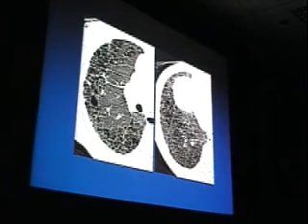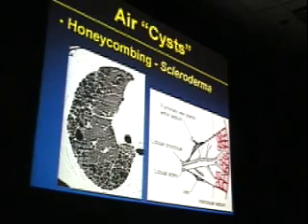Another patient with air-filled cysts on high-resolution CT. Notice that these cysts cascade one on top of another. They're variable in size. They're variable in wall thickness. And in this portion of lung, at least, they are distinctly subpleural in distribution. What is this an example of? Okay. This is honeycomb lung. Right? This is honeycombing. And we should be pretty confident in differentiating honeycomb fibrosis from other forms of quote-unquote cystic lung disease, such as EG or LAM. Now, in this particular case, this is honeycombing due to scleroderma. Maybe difficult to see, but there's a little dilated esophagus right there.